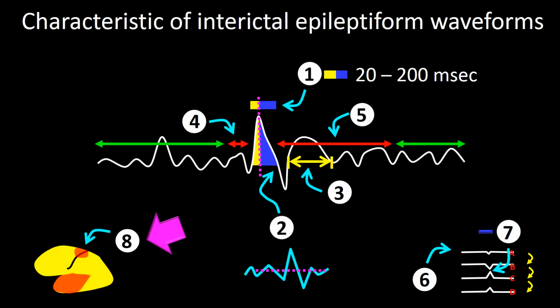They arise most frequently from the anterior and mid-temporal regions or at the vertex. In these regions, the probability of a seizure when a spike occurs is over 85%. If, on the other hand, the activity is present in the central, frontal, or occipital region, the likelihood of it being linked to seizure is less than 75%.